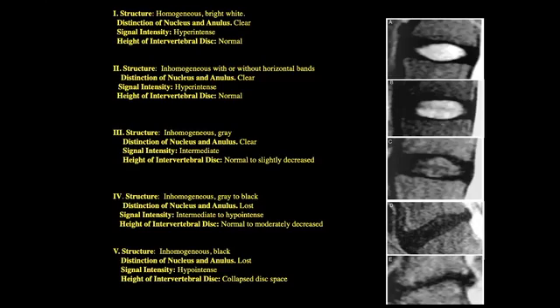It's a bright nuclear center. It's got a dark annulus fibrosus. Again, the annulus fibrosus has no free protons, so it's going to be dark on all pulse sequences normally. The nucleus pulposus has a water binding capacity, and that brings out the T2 signal. B is where you have a fibrous cleft in the center of the disc, which is basically a normal variant. As one gets older or more mature, we go to C, where the nucleus pulposus has now lost its water binding capacity and becomes more gray or darker.